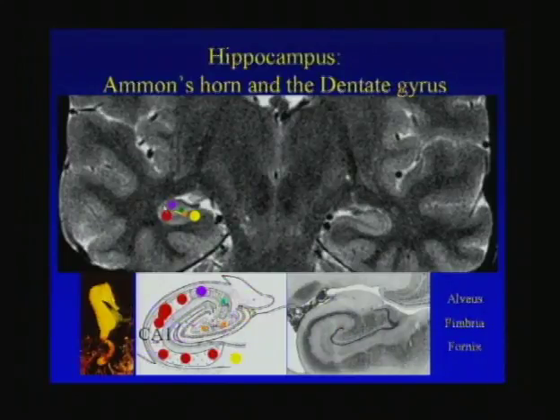It's also important to know that there's normal white matter above this gray matter, and there is some interspersed white matter in the hippocampus, but this is the efferent white matter pathway of the hippocampus, which is the alveus, the fimbria, and that will eventually form the fornix.